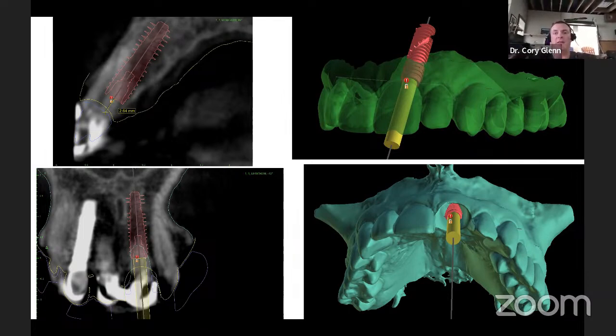And so a really simple way that I'll do this oftentimes is if I've got my intraoral scan with all the teeth there and it's stitched up, and then I've done the bone and the teeth segmentation, I'll just quickly do a Boolean subtraction of that particular tooth that needs extraction from my intraoral scan. If you're looking down here on the bottom right of my image, that's what you're seeing. I just did a Boolean subtraction of the root that BlueSky segmented from my intraoral scan, and that gives me this accurate extraction model that now I can do my treatment planning on.